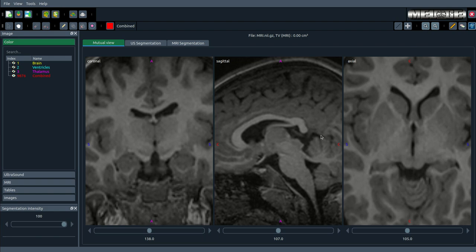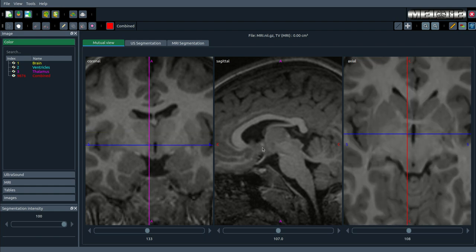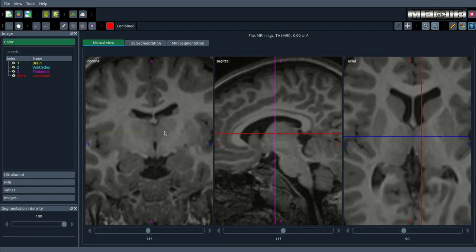I'm going to activate the link tool or synchronization part. It synchronizes the views. This means when I'm clicking on a point in one view, the corresponding points in the other views are highlighted. This synchronization aids in ensuring precision across different perspectives. Look how it's working.